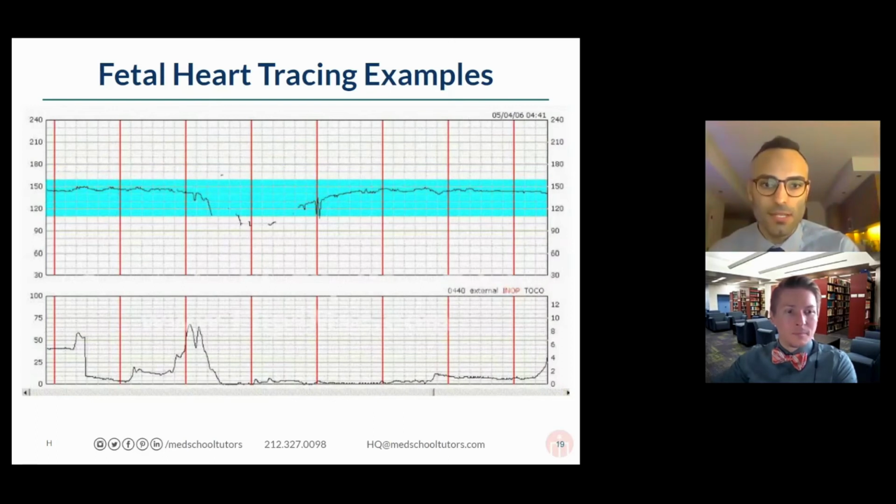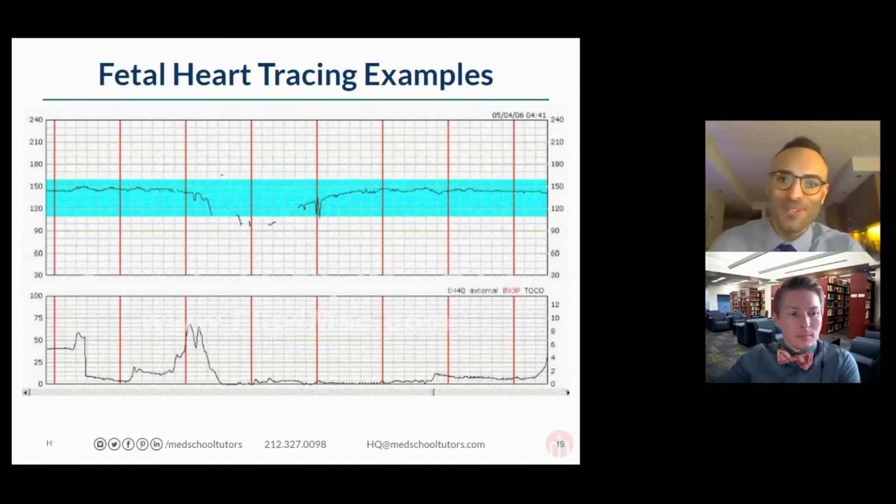Good. Okay, Matthew, Mario, good job. Late decelerations, uteroplacental insufficiency. Okay, Matthew, so hypoxia. Excellent. So you guys are already jumping the gun, but yeah, it's late decelerations that are occurring. And the first thing you got to think about when you see late deceleration, uteroplacental insufficiency.